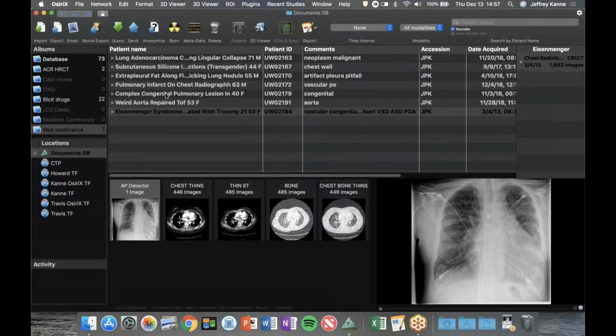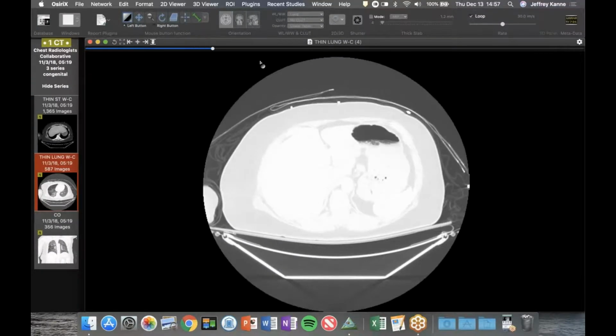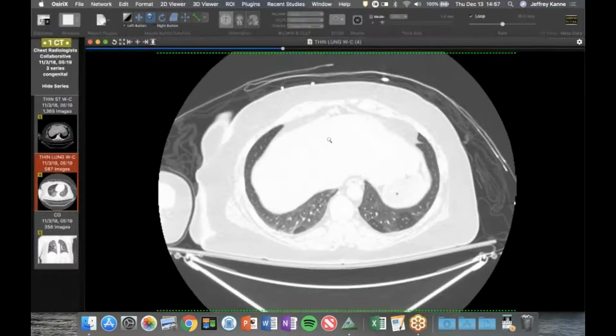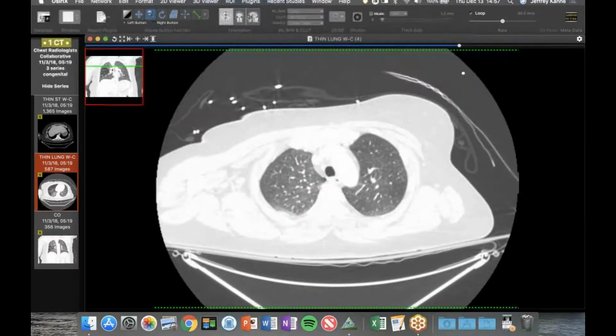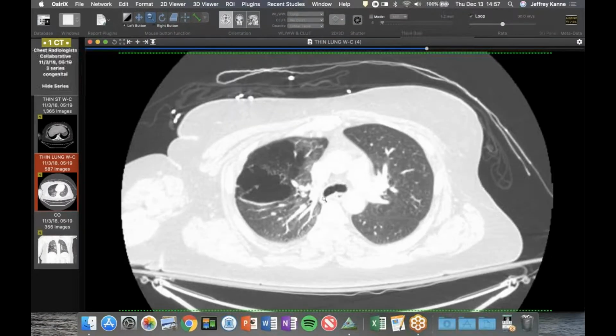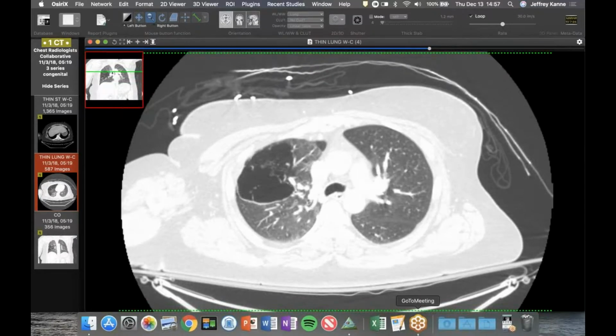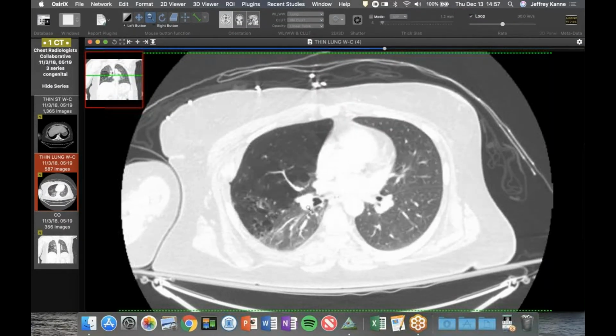Yeah. Those different things. And then along the line of congenital stuff, since we were talking about that, we always like to talk about the hybrid lesions. This is one that was picked up in a trauma, and honestly, I don't know exactly what we would call it, but clearly there's abnormal disorganized lung that looks like it got a little bit of an injury because there's some fluid and blood in it, but there's some abnormal airways in this. And additionally, we see hyperexpanded, hyperlucent lung.